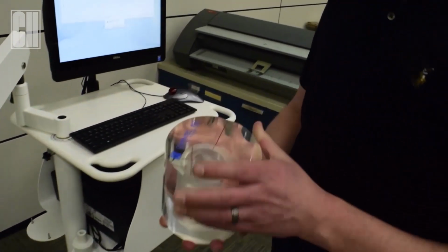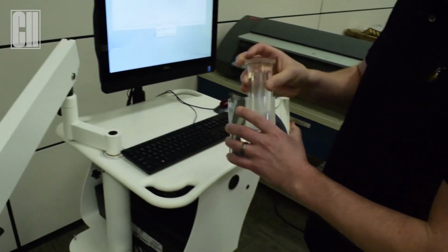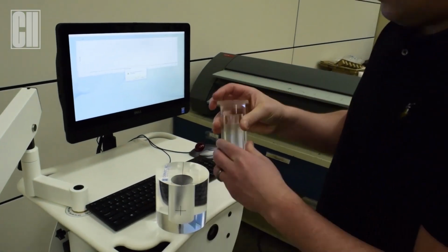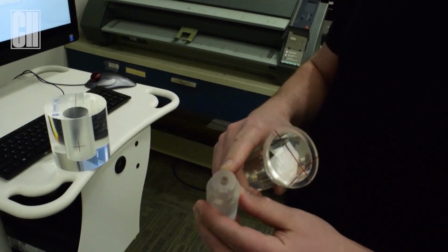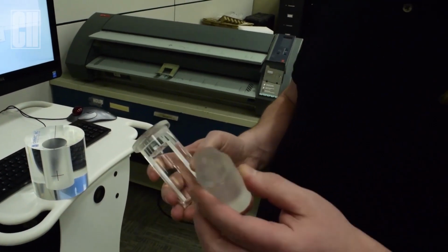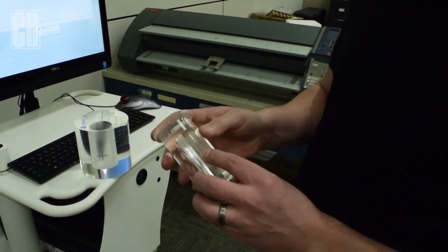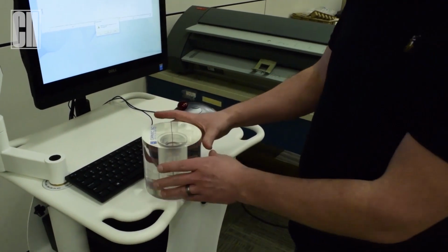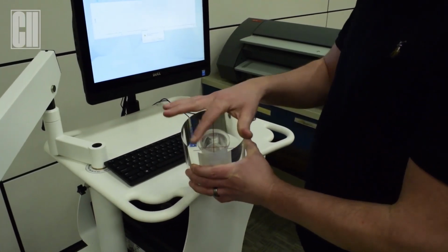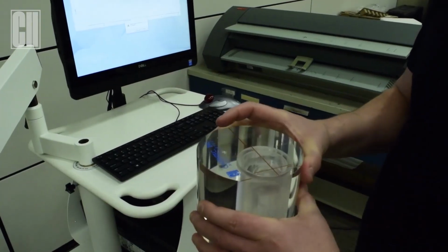You will grab your Phantom, take out your holder, get the capsule and slide it into the capsule holder. Or if you prefer to keep the capsule in the container, you can place it into this centering neck Phantom. And you want to make sure that the lines cross in both directions and line up, and position it where you want to measure your capsule.